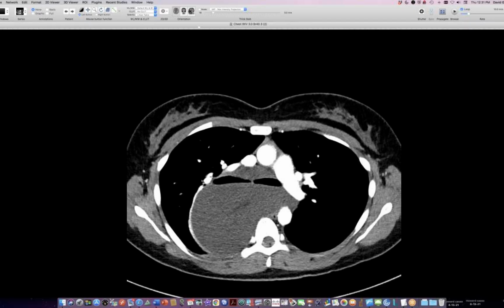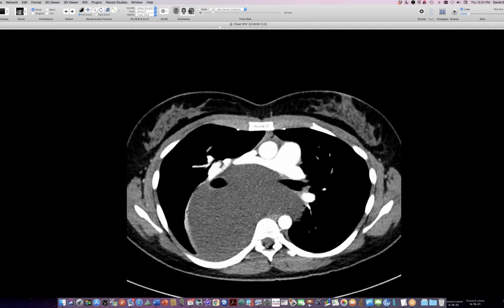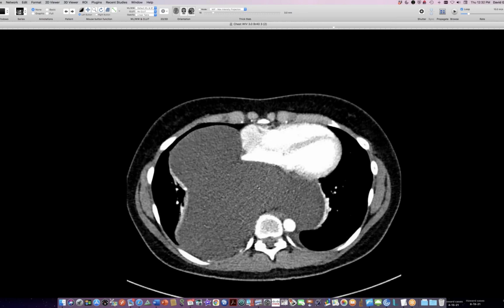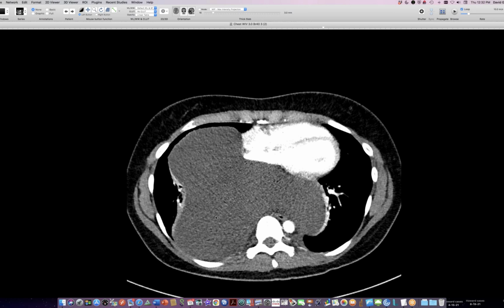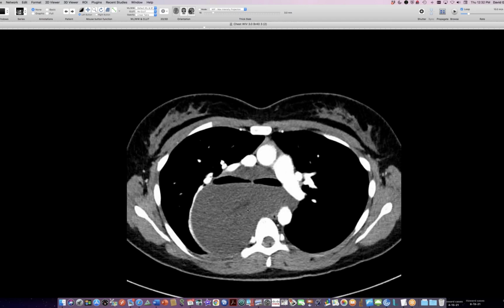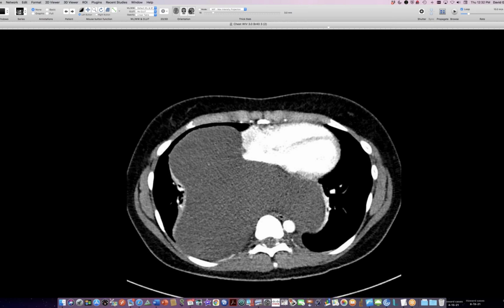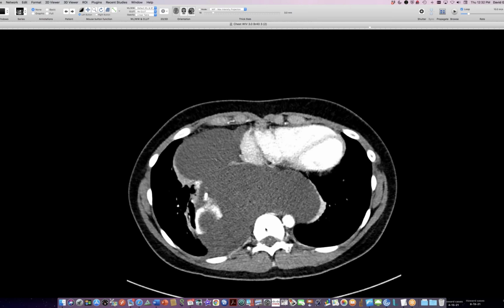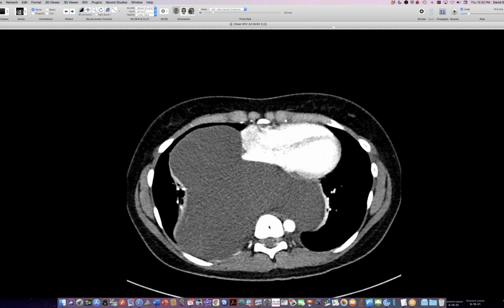Okay, and then I want to come clean, and I want to go back to this case that I showed a couple of months ago of this huge low attenuation lesion here that has low Hounsfield units around 20 in this roughly 20-year-old woman. And it has some septations in it and things like that on MR, which I'm not showing today. And it looks just like several cases that I found in the literature of chordoma. And chordoma can occur without spinal lesions being manifest.